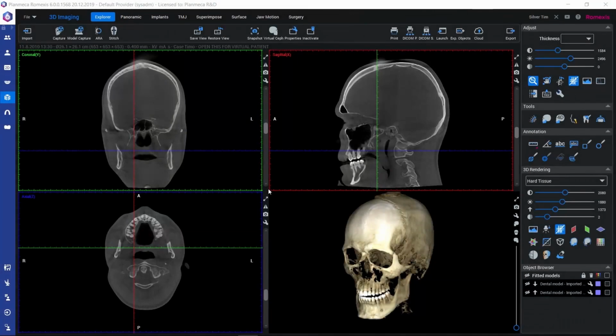In other tutorials, we have seen that here in Explore submodule, we have a couple of tools for segmenting different anatomies, teeth, airways, and jaws. What if we would like to segment, that is, to extract as separate objects and to know the volumes of other anatomies as well? For that purpose, we have two more tools here under annotation tools.